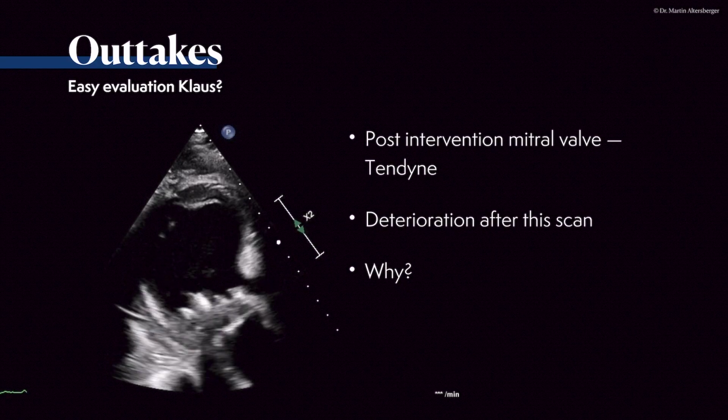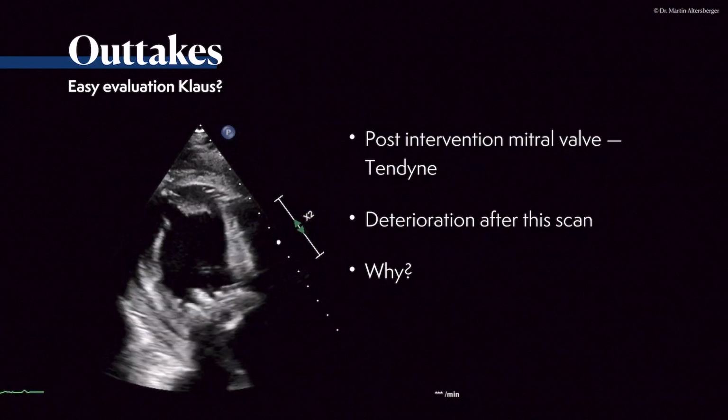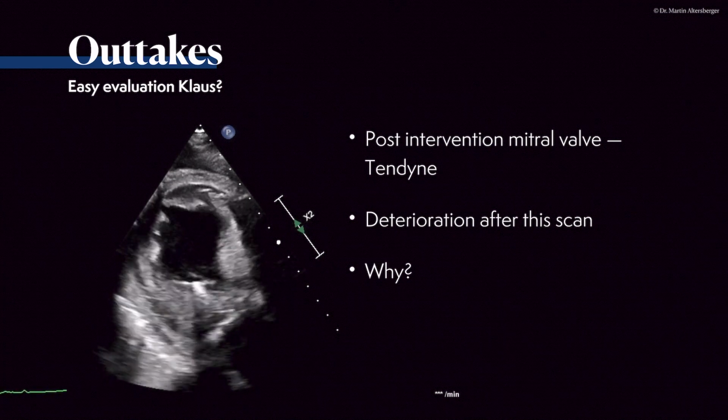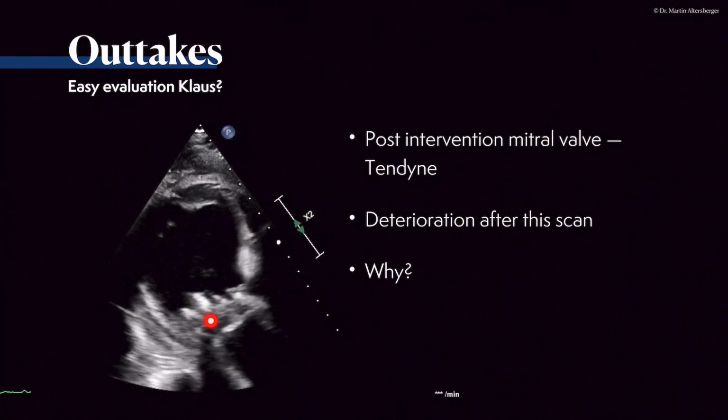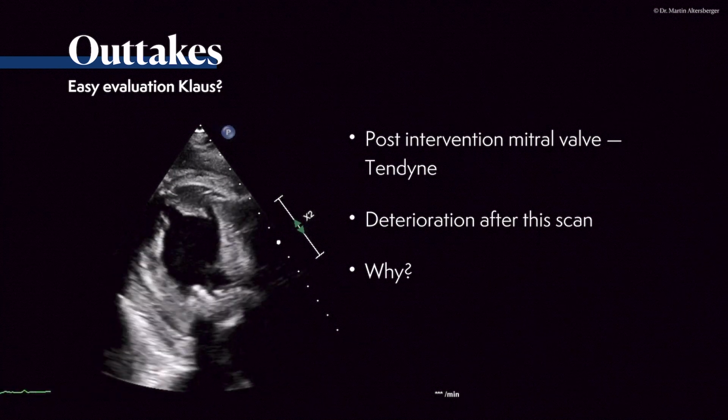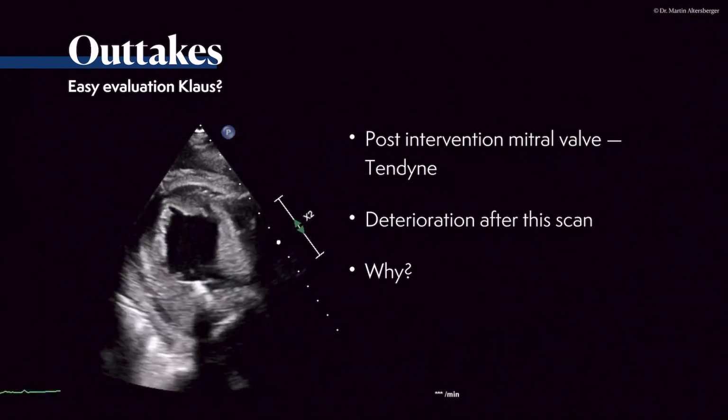One patient I want to present to you is Klaus, and everything is easy with Klaus. He received a Tendyne valve, a relatively new valve, where you see it's located over here. And this patient deteriorated after this scan, and we are going to answer why.